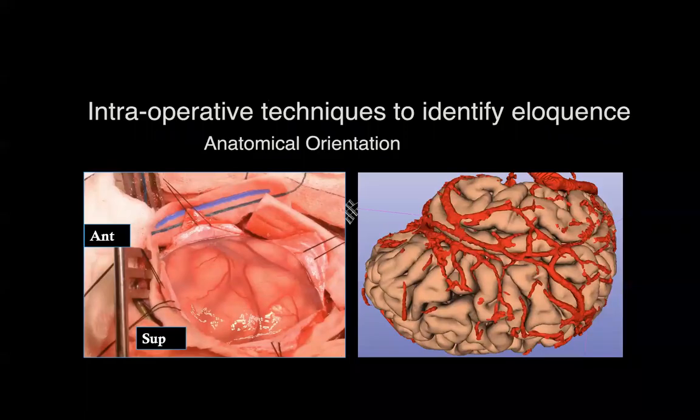And finally, what we do in our pre-op protocol is, in some patients, a CTA. Why? Because we don't only need the 3D reformat. You see, this is a 3D reformat that we did exactly in the same orientation as the brain when the surgeon opened the skull looking for the area to cut, and we overlap the vessels on CT.